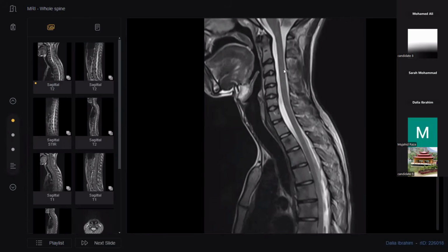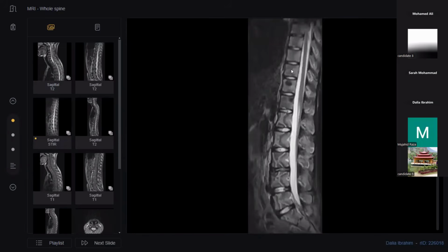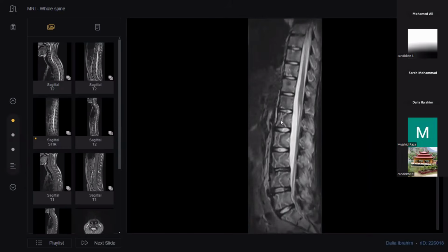Okay, so our problem here is not about the straightening, and it looks like we don't have any spondylodegenerative changes like in the other case. But rather the hallmark of this disease or of this patient involves the bone marrow. Okay, we have 3 pathologies involving the marrow of this patient. Can you tell me the 3? What are the 3 abnormalities you can see?